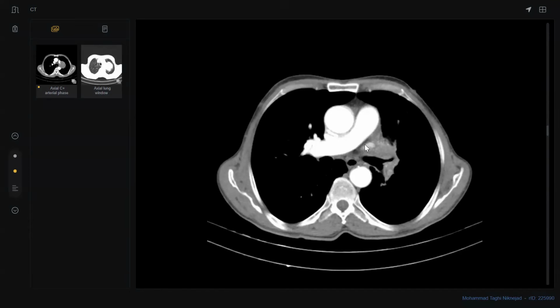This is most likely due to pressure effect, I guess. Where? Show me. Scroll and show me why. Okay.